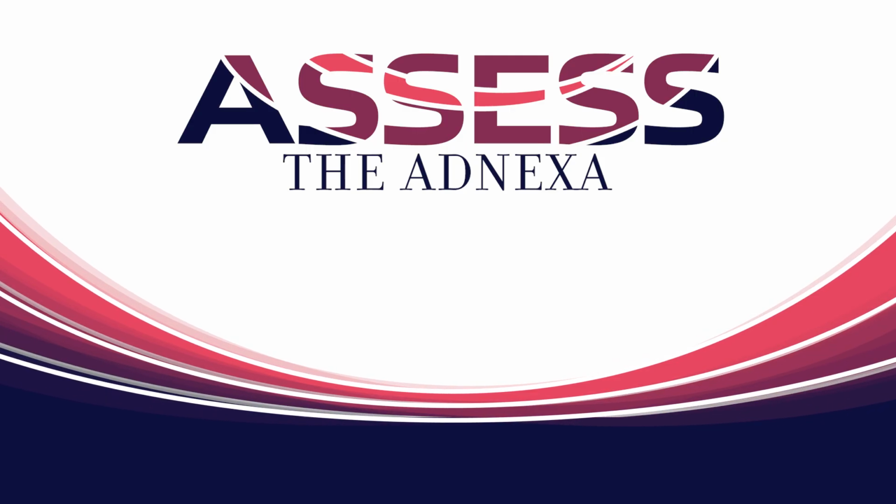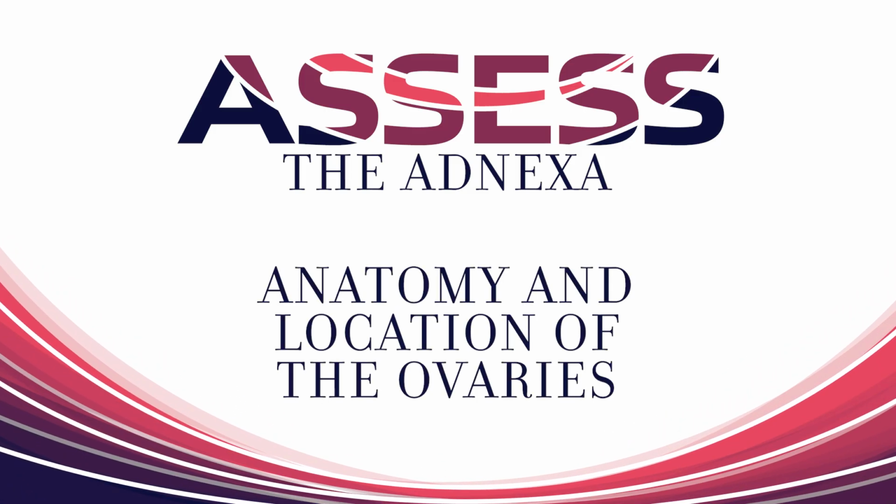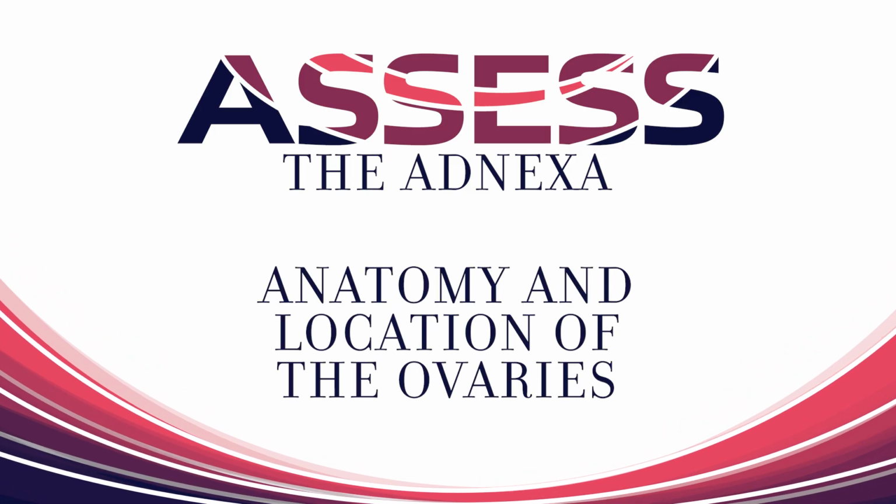Assess the adnexa. Ovaries. Anatomy and location of the ovaries.